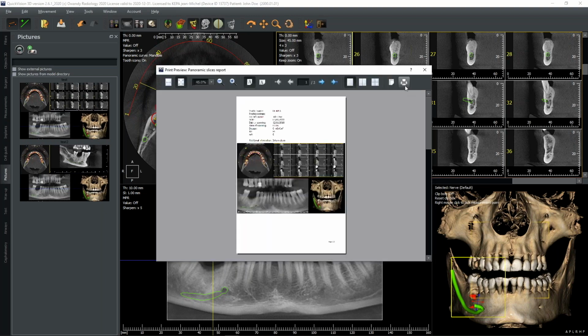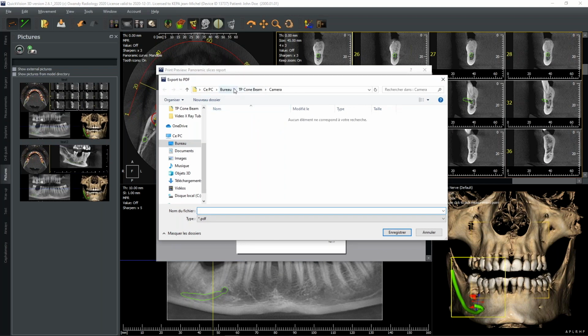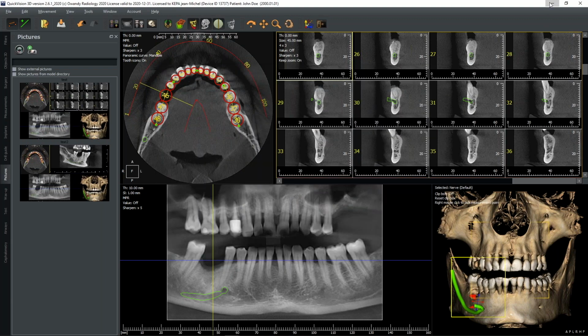I have a view like this. I should say print. In reality, I don't print. This is just a way to save. So report here. We'll name 200526. 36, change it, 26. Register. Now my PDF, my report is created and registered.